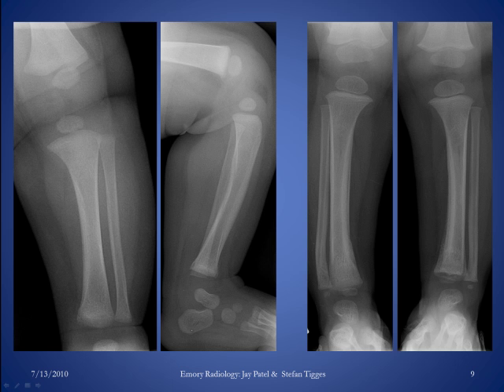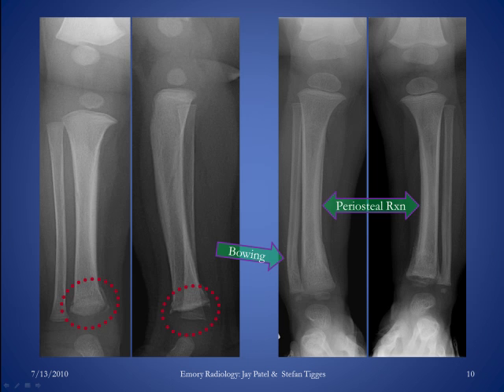In addition, patients with cardiac defects or with PDAs that need to be kept open are typically on prostaglandins, and prostaglandin therapy can also produce periosseous reaction that looks like this. So the history is important. These images are basically showing the findings described on the prior films. The red circles or dots are outlining classic metaphyseal lesions, or corner fractures or bucket handle fractures, and the right films are depicting periosseal reaction, and there is some bowing of the distal fibula on the left.